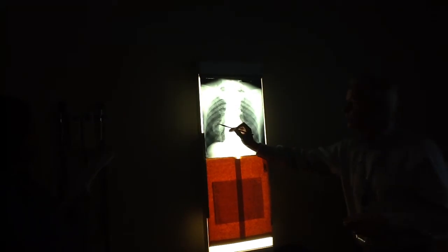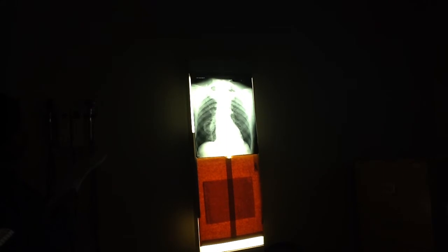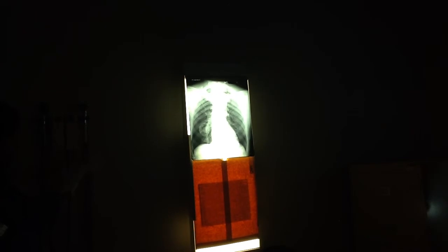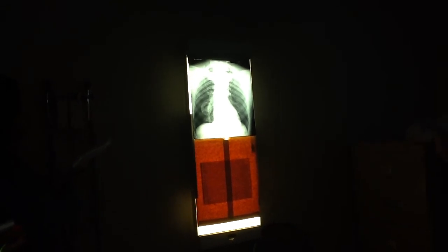What do you think about the wall thickness? You see, that's why there's lucency in here. This thing's cavitated. Do you get a thin or a thick appearance to that? Thick. That's a thick wall. Thick can be up to 1 centimeter. Thin wall is measured just in a few millimeters. Thick is like 1 centimeter or more. So that's got the well-defined thick to it. And the inner border, kind of lumpy, nodular, but still kind of well-defined. Well, this is a tumor, and it is cavitated.